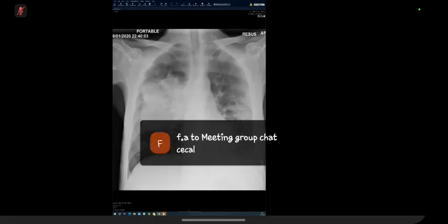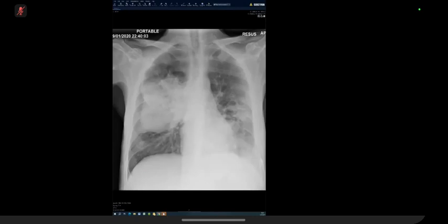This can be pulmonary hemorrhage if the patient has a history of collagen disease or abnormality like bleeding tendency. So I would like to review the clinical history of the patient and see if previous X-rays were done to compare the course of the disease. I would like to communicate the findings with the referring physician and ask for further CT for more characterization.